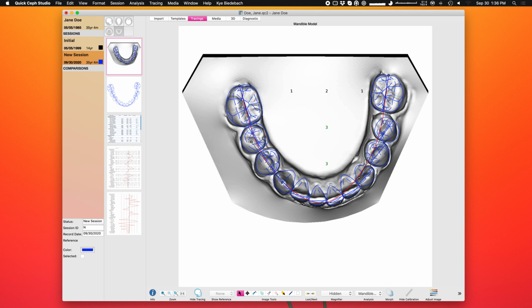If you need it to move individually, like on this side, I need to pull this a bit out. It's not symmetrical. So you can hold down the shift key. If I hold down the shift key now and click this, see I can move just that side on its own. And then if I ever want it back, if I don't have the shift key clicked and I click on this one, it's just going to put it back to the starting point. See, it's back to that beginning catenary curve.